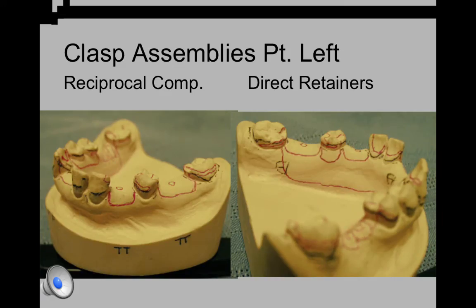The design shown is one solution to the design for this cast. It shows all 4 direct retainers using lingual retention. Tooth number 18 has the simple circlet direct retainer going from the mesial to the distal on the lingual. The survey line showed equal undercut on the mesiolingual and distal lingual, so simple alteration would be needed in both places to place the first 1/2 to 2/3 of the direct retainer arm above the survey line. So I chose the simple circlet cast circumferential clasp over the ring clasp.